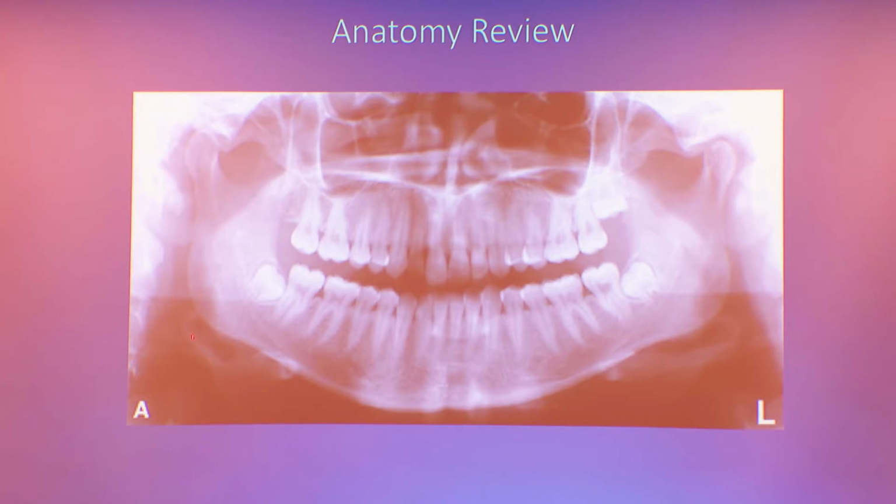So just the basics, hyoid bone is here, inferior cortex is here. If you look at the inferior cortex, here it looks more opaque, here it looks more opaque, because it's overlapped with hyoid and spine shadow. Here it looks more lucent because this is the posterior dorsum of the tongue. This is the ghost of the contralateral mandible. So this is left mandible through tongue. This is left mandible through ghost. This is left mandible through neither. So you can break down all the densities based on what the borders are.